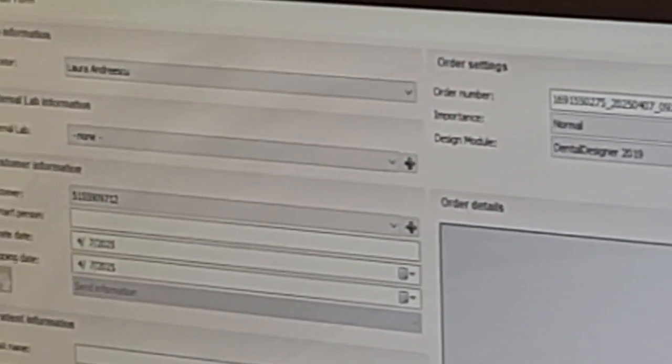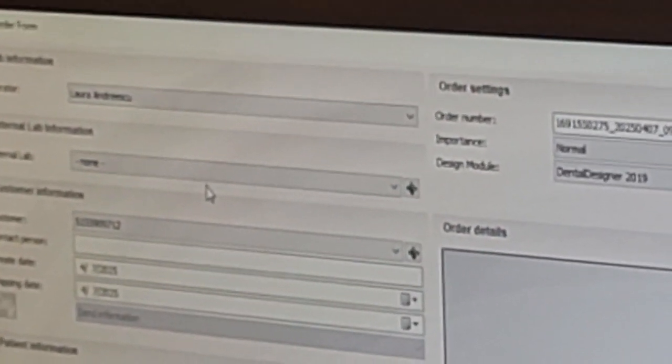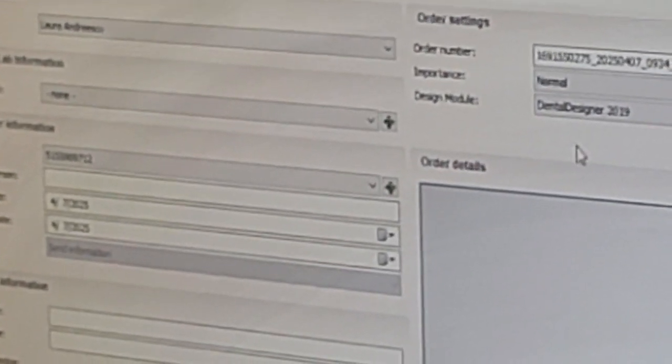And here you build up that library. It's like an address book. We don't have it because we're not going to send that out, but you build up that address book, and if you want to send it, let's say I'll send it to Argent, I should have the information here. I'll click on it, I'll select Argent, and it's going to go in there, okay?